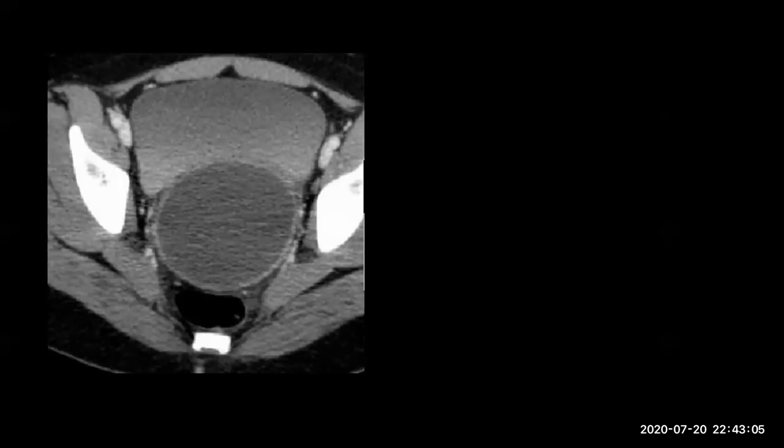Axial CT scan with IV contrast at the level of the pelvis, showing a midline well-defined fluid density cystic lesion of thin wall, in the midline posterior to the bladder, anterior to the rectum. Okay, what is your differential? Duplication cyst. One of the differential, yes. Other differential?